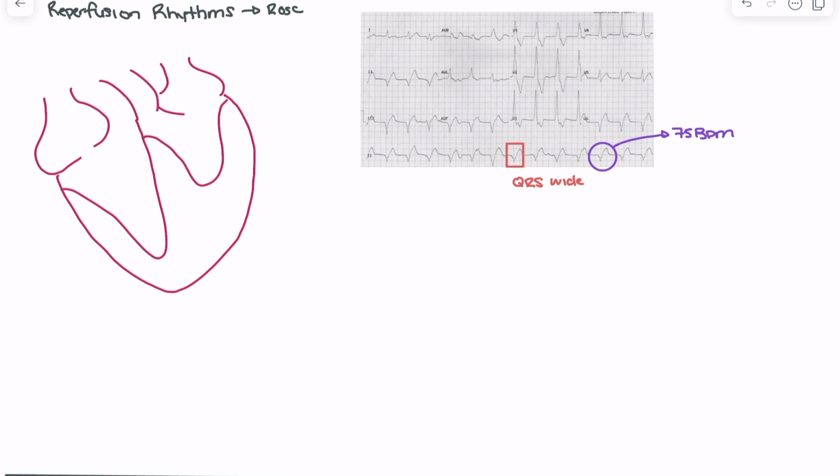What can happen sometimes is this can be misdiagnosed as a ventricular tachycardia, especially because this type of rhythm can be generated from anywhere between 40 to 120 beats per minute. But its rate, the width of the QRS, and the absence of P waves, and you might be saying, well, I actually see a few P waves here, which there are some. So for example, here there's an escaping P wave, but we don't have a general association between P waves and the QRS complexes. So this would be an escaping P wave or a non-associated P wave. So if that's the case, then this is likely an idioventricular rhythm.